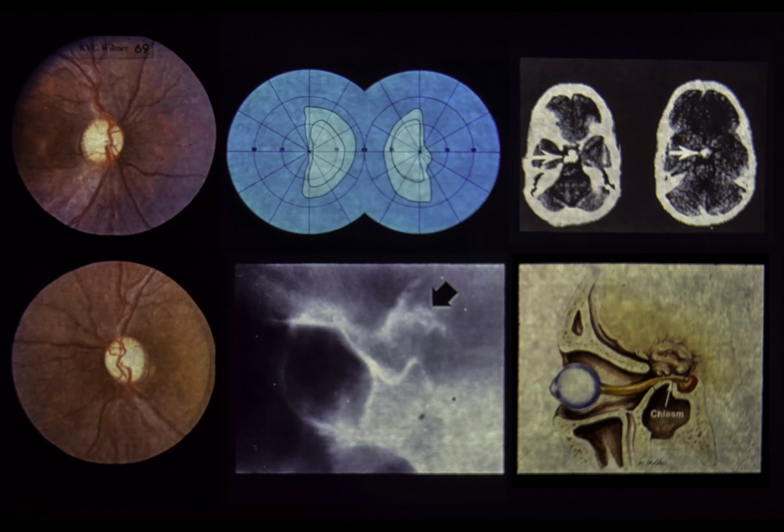Slide 69. Optic atrophy and craniopharyngioma. This 9-year-old male complained of headaches for 3 months. Visual acuity was 20/50 OU with diminished color vision and normal pupils. Upper left and lower left. Both optic discs are pale, with the pallor restricted to a horizontal, band-shaped area crossing the disc. The upper and lower poles of both discs have a normal pink color, and the superior and inferior arcuate nerve fiber bundles are seen well in both eyes.